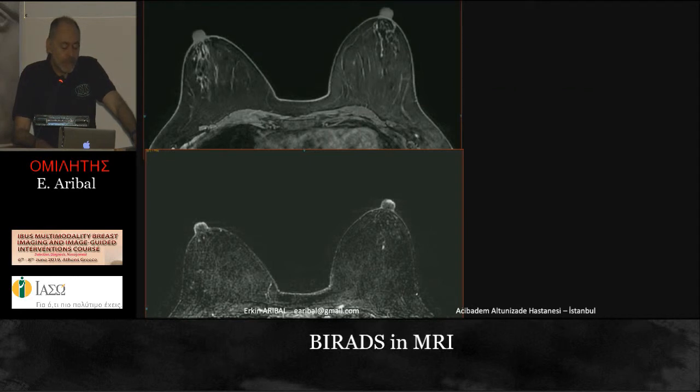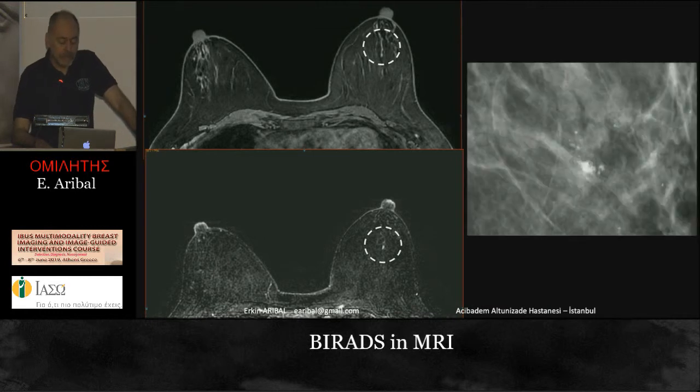And this one, this is the T1 weighted image with fat saturation, and this is the contrast subtracted image, where you see something here. It's a duct with signal inside, and after the contrast enhancement there is a focus here, which is enhanced, with a fast increase and plateau.